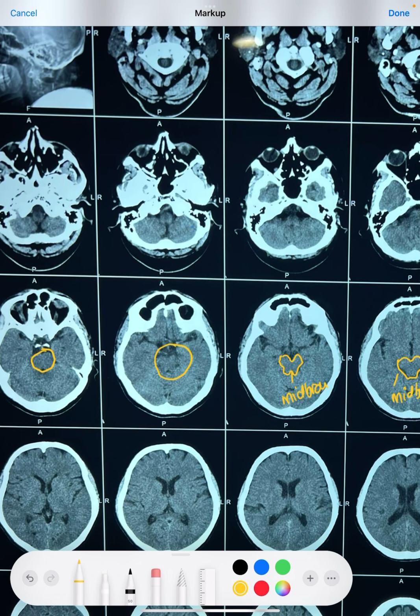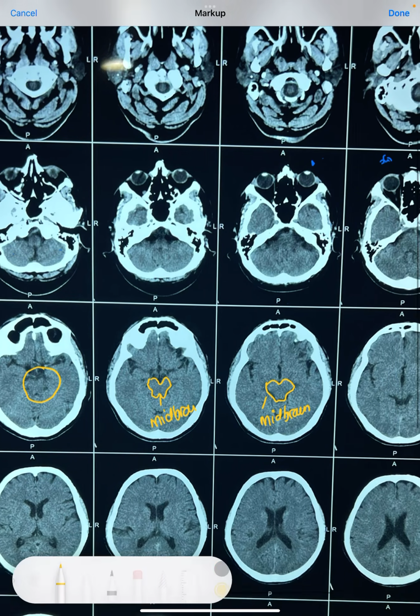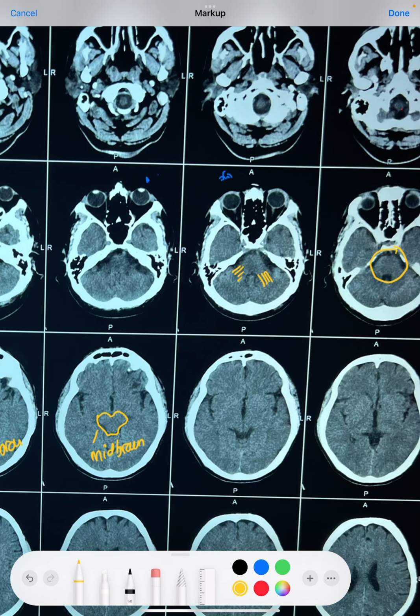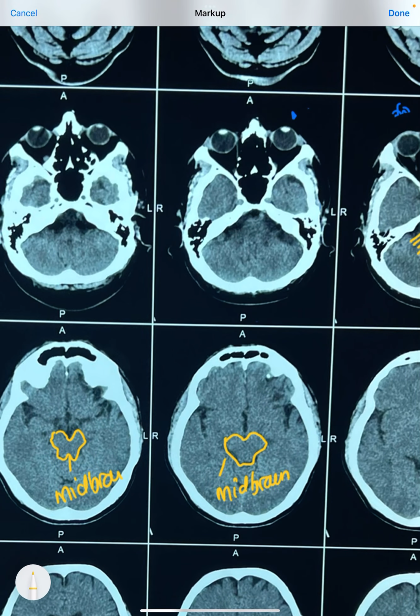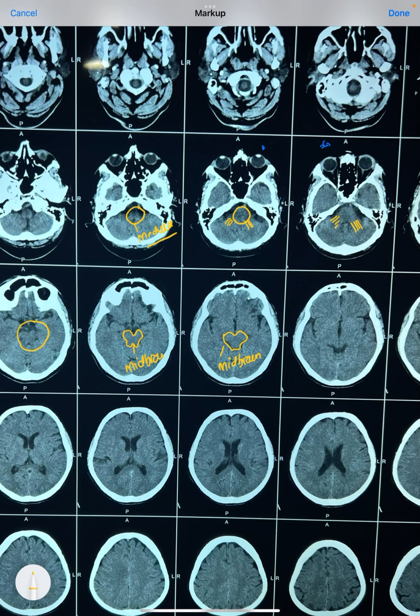This is almost complete circular structure. We can notice this is completely circular structure. Here also, this is all pons, and this structure is pontine and cerebellar connecting fibers. These are all fibers which actually connect pons to cerebellum. Here also you can see this is the pontine structure, and this then continues as medulla oblongata. So this is medulla, this is pons, and this is midbrain structure.